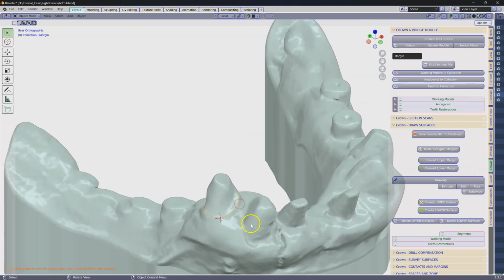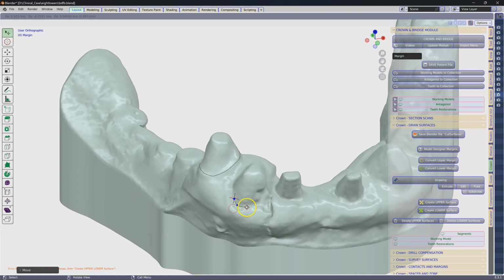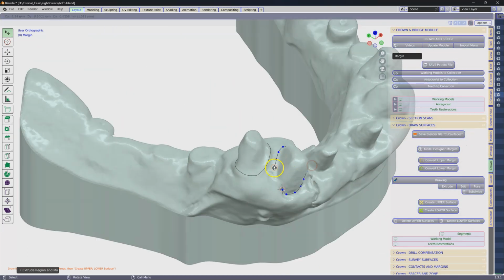So I'll make 2 so that here we'll show, we'll draw this like that, extrude it all the way like this, and then we're going to be cutting it. You can do all of them in one go, but if you're not confident in cutting all in one go, then just create lower surface.